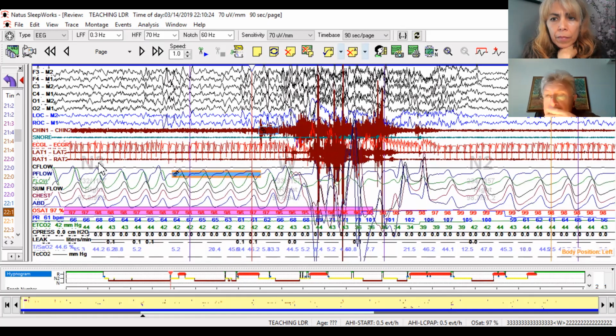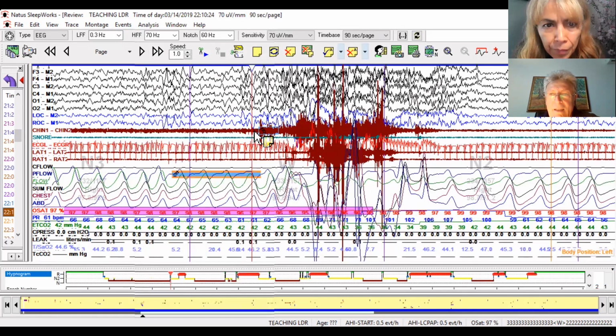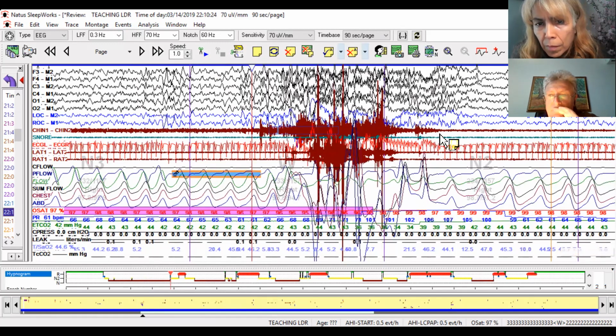So this movement is a long movement. I would say it approaches the maximum of 30 seconds. Let's take a look. It is about 27 seconds in my eyes. Oops, let me see. Yeah, so we have 27.8 seconds.